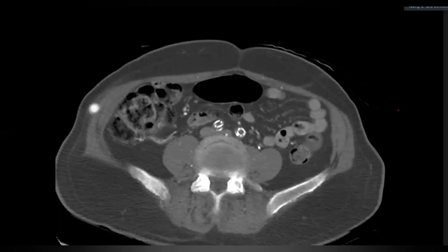Yes, sir. In the given lower images, the lumen of the aorta appears to be getting narrowed, with no contrast opacification in the bifurcations. Common iliac bifurcations are noted, and there appears to be some stenting in it. Okay. Excellent.